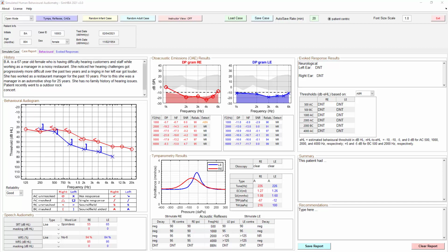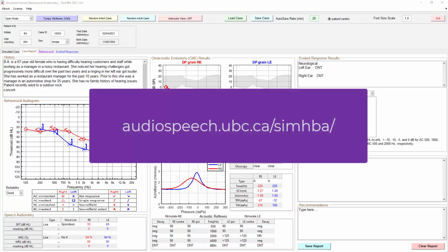This summarizes some of the basic features in SimHBA. I hope you enjoyed watching the tutorial. Check out more tutorials on how to use SimHBA and how to perform behavioral audiometry and other tests on the SimHBA website. Have fun learning.